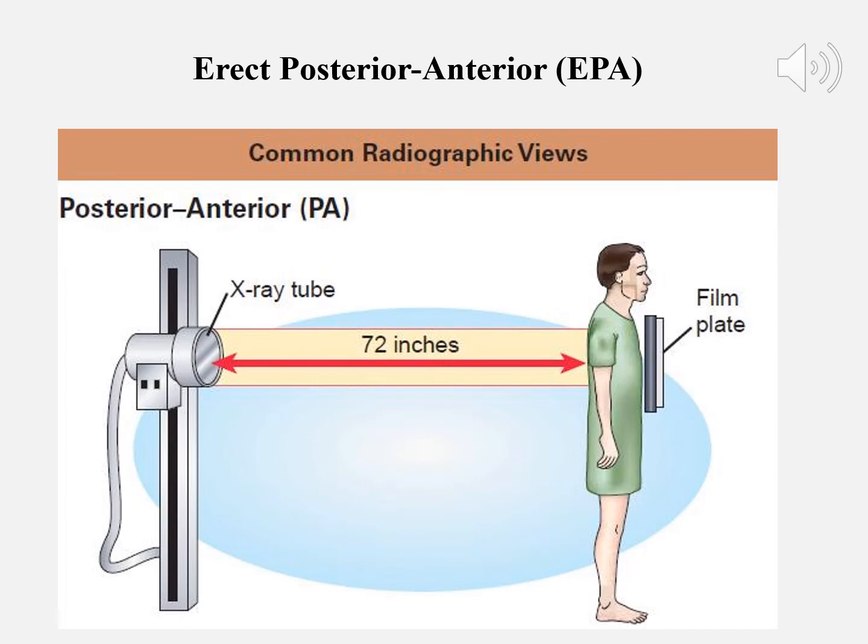All right, so erect posterior and anterior view of the chest. This is the gold standard in chest x-rays. This is generally where the person leaves the bed, is wheeled down to x-ray, and stands in front of an x-ray box or plate. Sometimes we'll put their arms around it, hug it, and an image is shot. But this again may be reviewed.